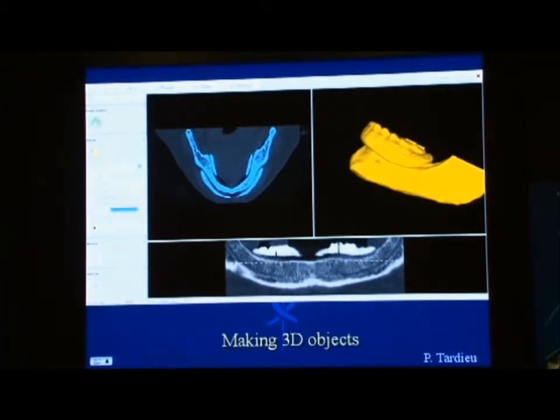Now I am going to make a second 3D image, which is called the prosthesis. I set up the threshold, I go around 1,300 and something, 1,200, okay? I click on the prosthesis and I'm making a second 3D image, which is the image of the prosthesis.